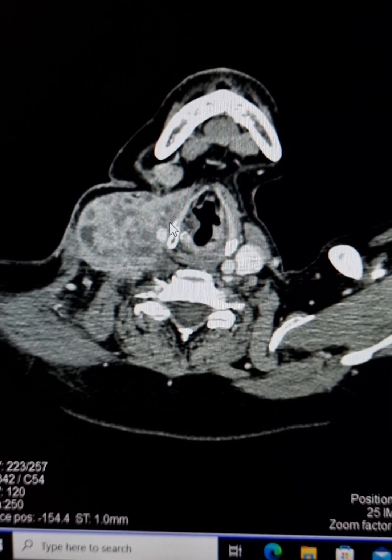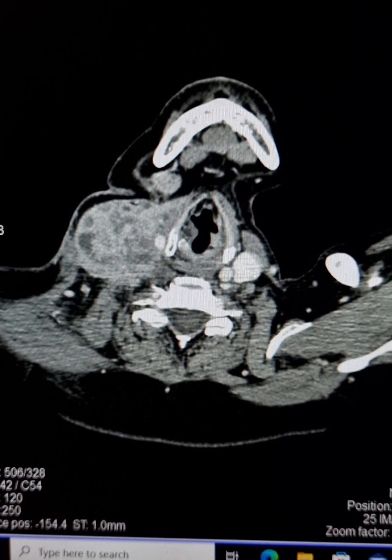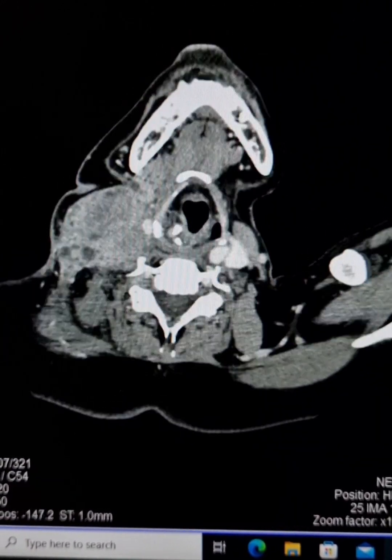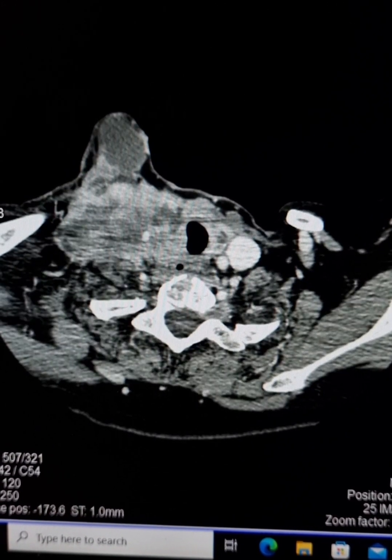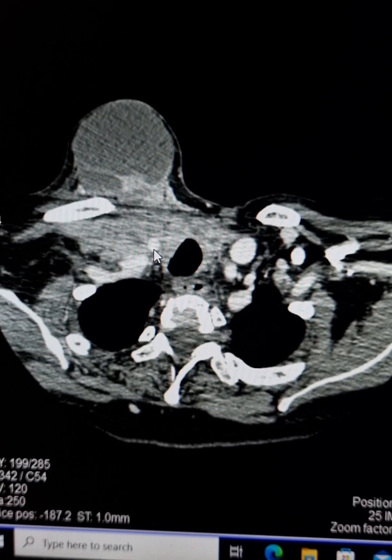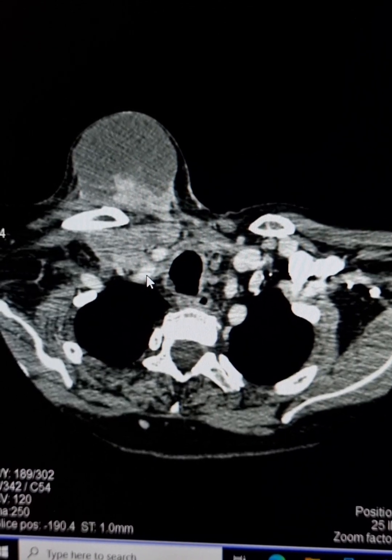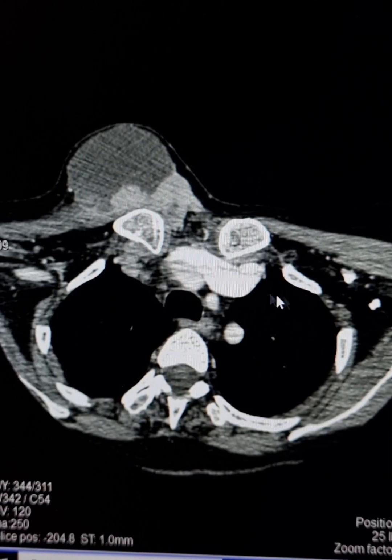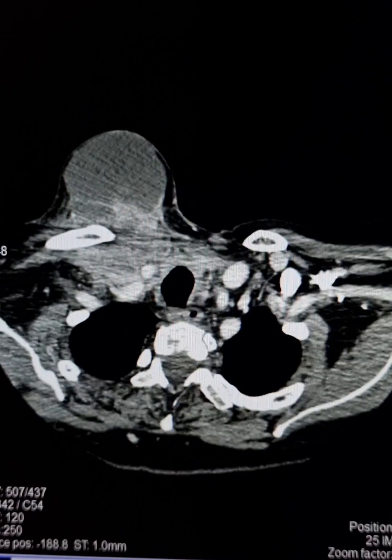The artery has relatively rigid, thicker walls. So usually their occlusion is quite late as compared to the venous structures. Now, if we trace it downwards, this is the common carotid artery here. The mass has also surrounded the terminal part of the subclavian artery. And this is the brachiocephalic trunk of right side.